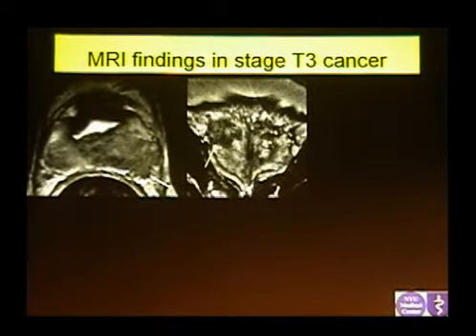So, for instance, this patient had an extensive tumor here. You see in the left peripheral zone, there's a TURP defect here. You see extensive low T2 signal, but you see also irregularities here in the left peripheral zone as opposed to this. This is more smooth here, but you see a lot of irregularities going outside the prostate into the fat. That's why you need to keep the fat also. And it's probably going also to the neurovascular bundles on the left. You see this is the normal neurovascular bundle on the right, which includes the vessels and the nerves, and you see there's a continuity between the neurovascular bundles and the soft tissue lesion. This is a T3 cancer, not operable.